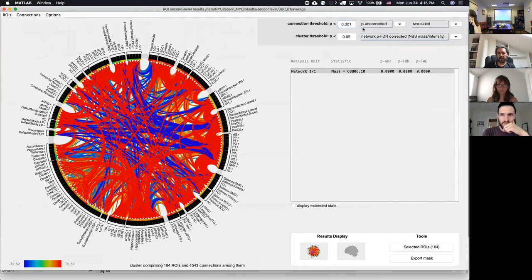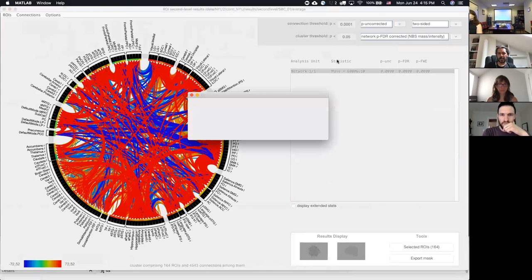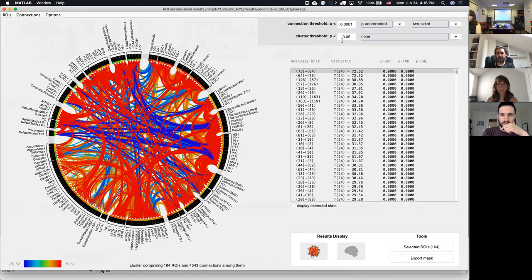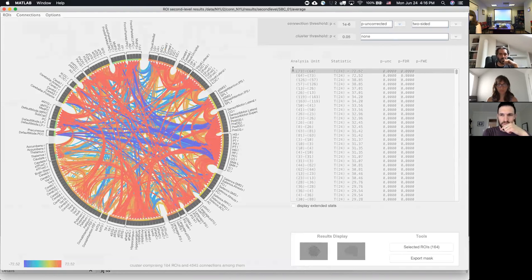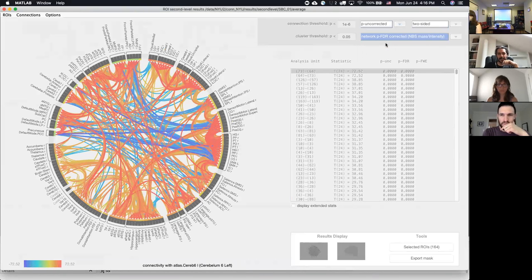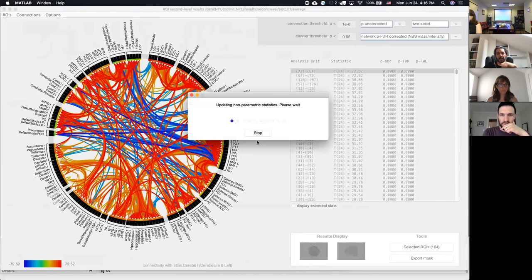Try to run the statistics before this. Yeah. It's going to take a minute to do it, so switch to anything else. Let me just see if I can switch to that. Let me see if I can do that. Okay, so while this runs, it will take a minute.